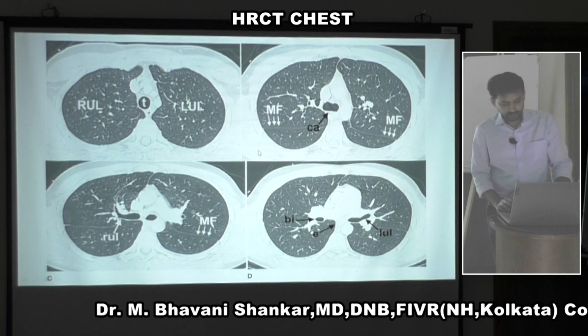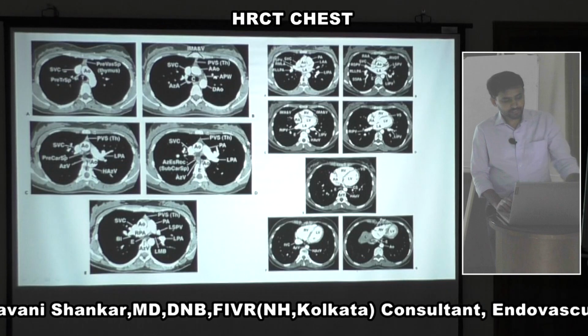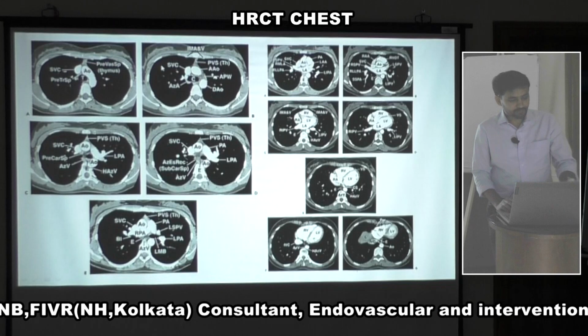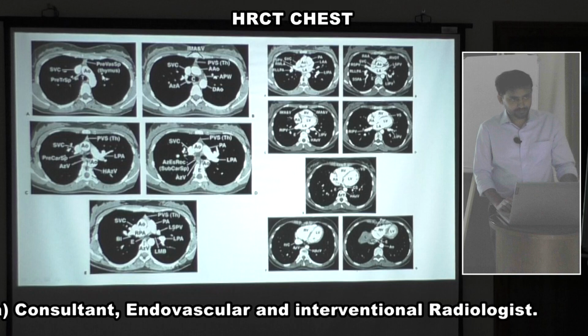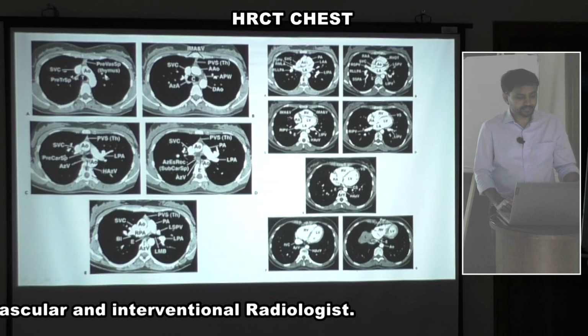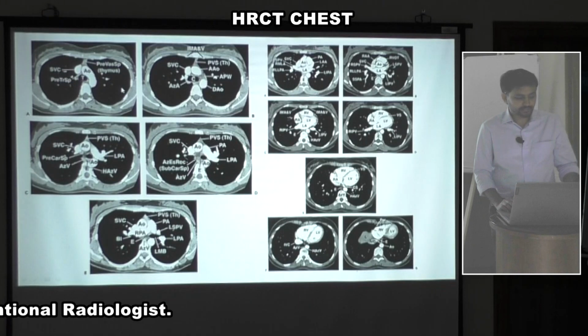These are all lung windows, and this is the mediastinal window. This is actually a contrast study. The mediastinal window helps us read mainly the vasculature, trachea, esophagus, and any upper abdominal structures, and any old healed granulomas or calcifications in the lungs, and any calcified masses.